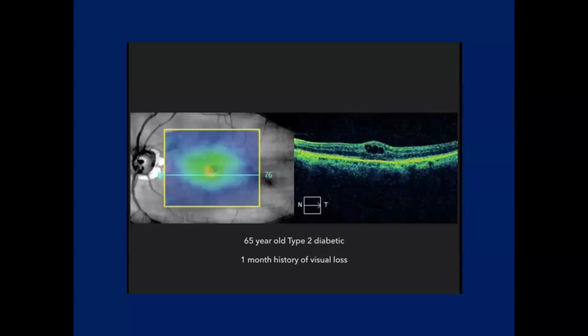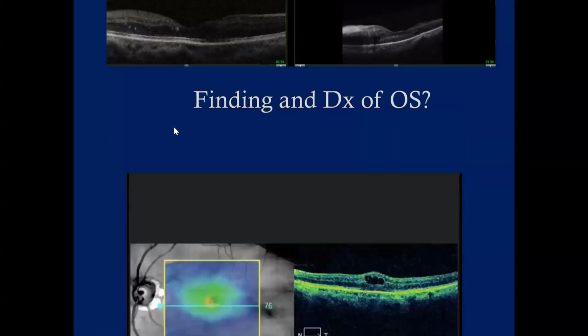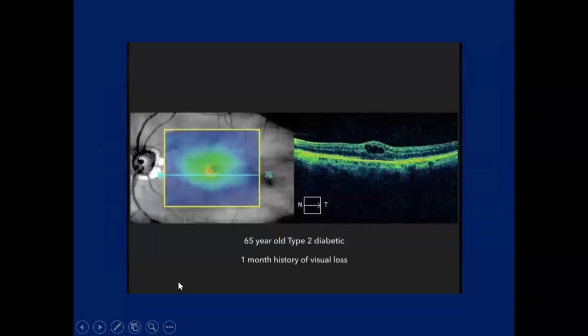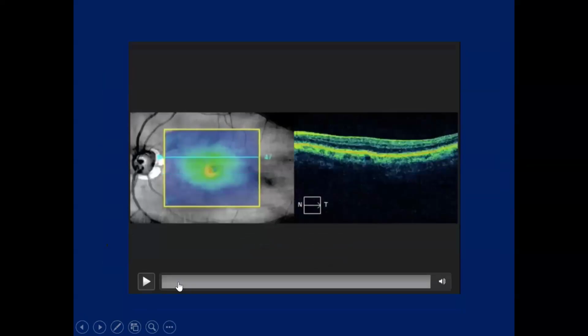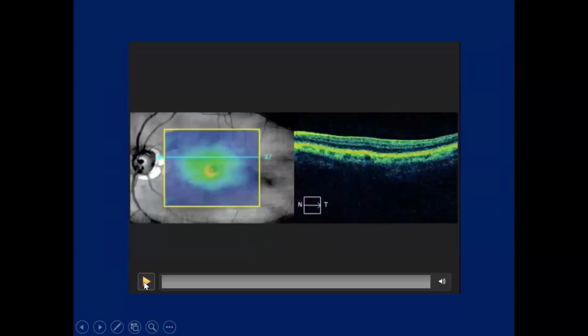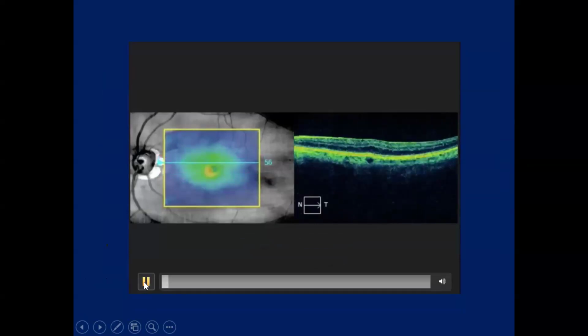It looks like an intraretinal cyst, but on the infrared it could also be somewhat of a macular hole, which has maybe VMT, which was separated. The differential could be more, but there are cysts. Okay, I will go to the next slide and you will appreciate. And then what happened? Follow this video, please.